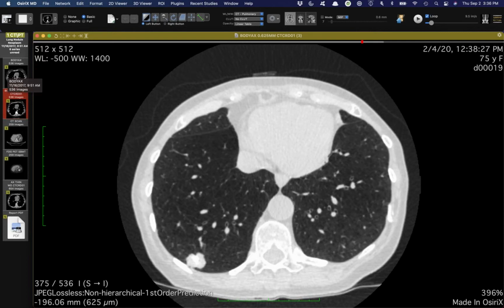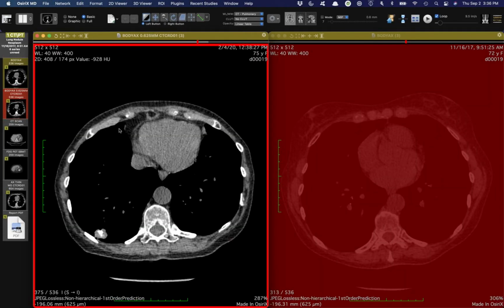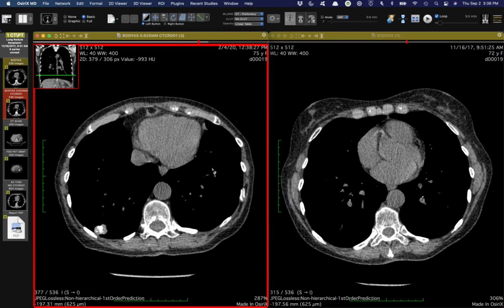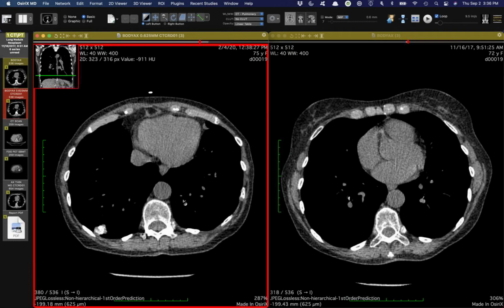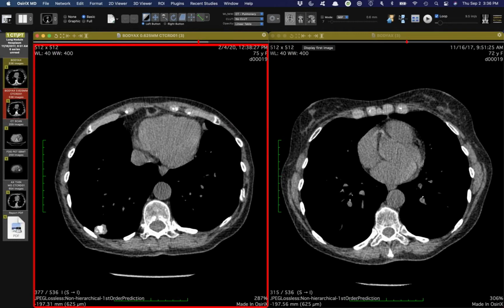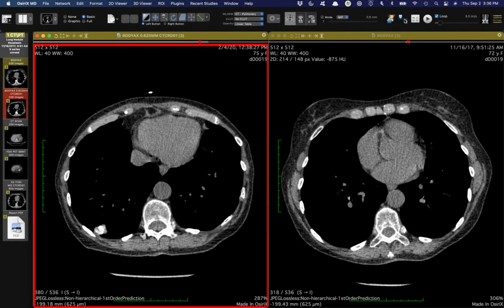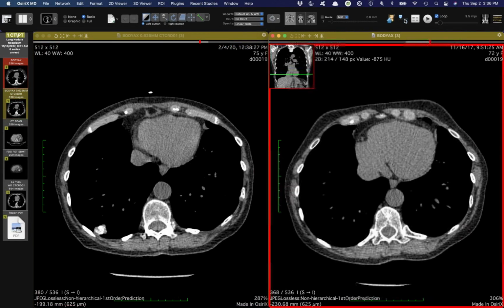Well, yeah, I would discount hamartoma in this case because it's lobulated. Hamartomas are very nice spheres. They don't have this lobulation sort of pushing out, this margination, and the calcium. A lot of that calcium is very faint. The calcium is usually very crisp. So I think this is an adenocarcinoma.